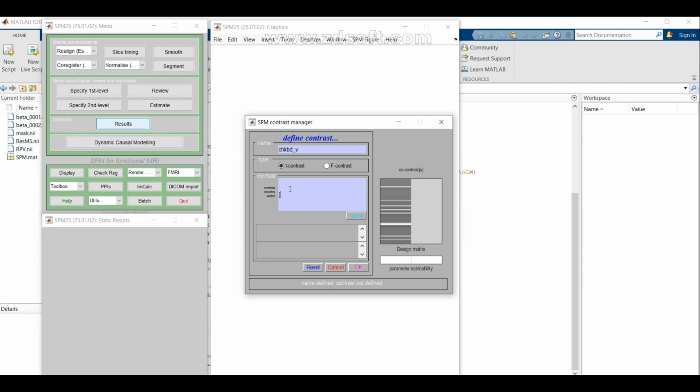So I'm going to write 1 and 0, and now I can submit. And after you submit, you will see something like this.